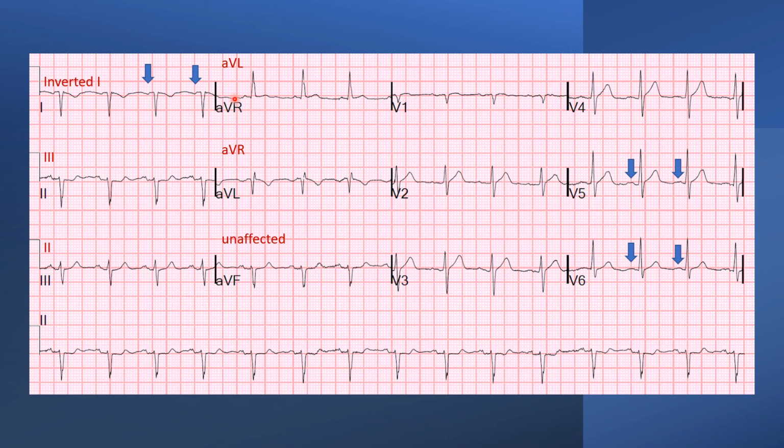So why is it not dextrocardia? Because if you looked at your EKG, the one that you got, you had positive P waves in leads V5 and V6, which should not be the case in dextrocardia. In this case, it's not a big deal because you also have good R wave progression, which goes against dextrocardia, right? So the R waves get bigger and bigger as you go across the precordium from V1 to V6. So that tells you that it's not dextrocardia. In addition, your P waves are also positive in V5 and V6.